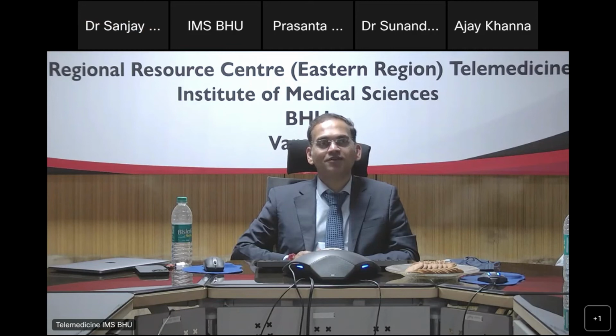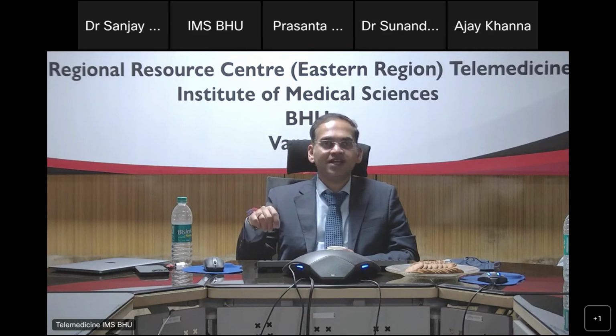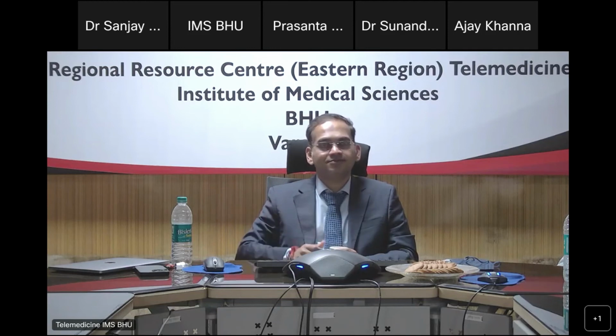That would be an example of non-type A, non-type B. Another example is where the arch is involved only partly. For example, if you have an intimal flap located between the brachiocephalic and subclavian, it's a focal dissection. The surgeons can debate about it, but that would be another example of non-type A, non-type B.